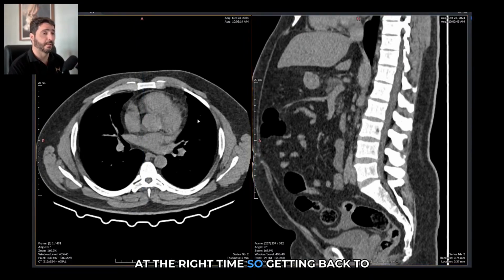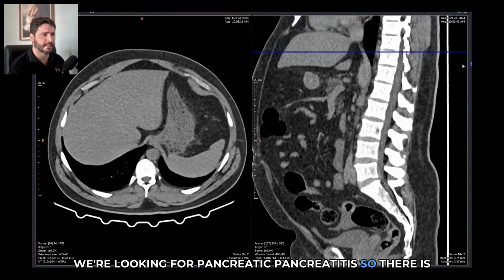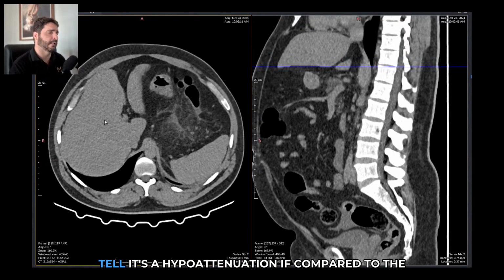So getting back to this case, this is an abdominal CT scan. We're looking for pancreatitis. There is clearly a steatotic liver right here. That is fat infiltration. It's moderate because I can readily tell. It's hypoattenuating if compared to the spleen.